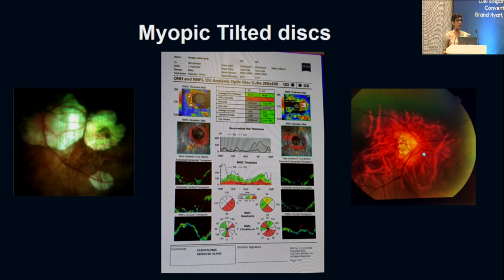I can only say that those people who have advanced glaucoma, they get multiple artifacts on the OCT RNFL, and therefore it is very difficult. It's full of pitfalls. You can see that in this OCT, the ring for measurement would be falling on the peripapillary atrophic areas, or even on these staphylomas. In this picture, on the myopic crescents, there is also motion artifact because the patient is unable to see the target because of the advanced vision defect, and also there is cut edge artifact because of the patient seating. So you can see that there are areas which show supranormal thickness, and therefore the OCT is not an appropriate way to look for myopic glaucomatous disease.